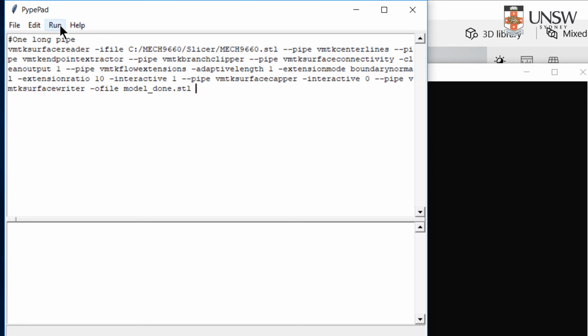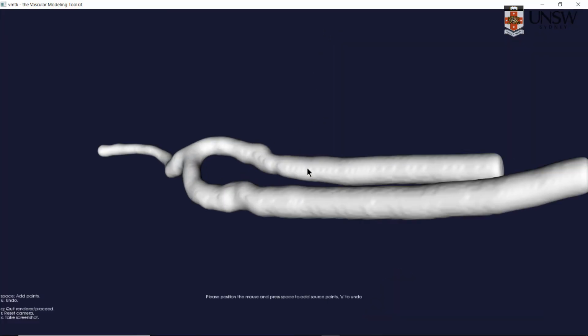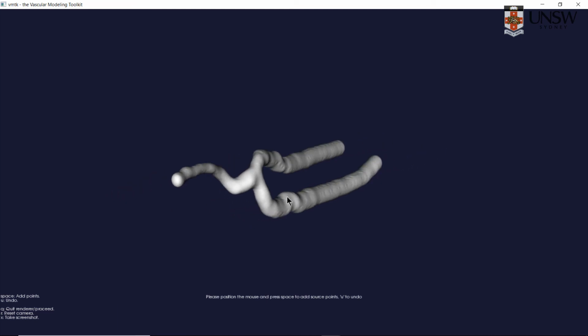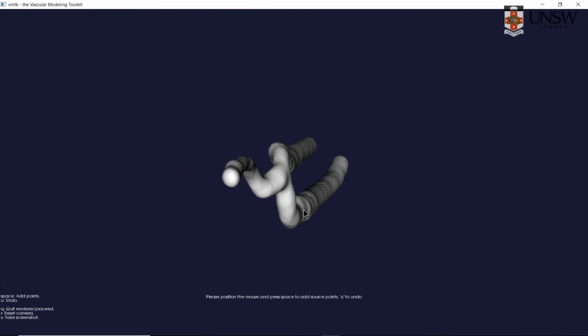So once you copy the code, you can choose to run current line, run selection, or run all. I choose to run all now. And the next one that you will see is this screen here. You can use different smoothing methods before VMTK to smooth the geometry. There's software like MeshLab or different things, but this one was just right off 3D Slicer. So if you don't think that it's smooth enough, you can use MeshLab.